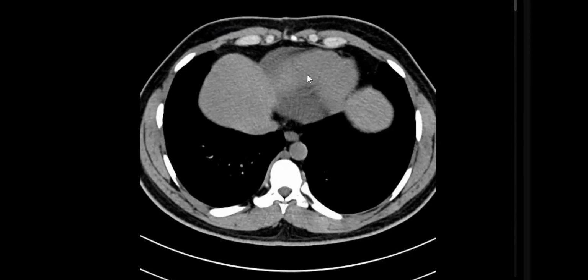Excessive smudging of the fat planes. Can we see the appendix separately in phlegmon? Sometimes no. But take care. If you see the appendicolith outside, it means rupture. So the appendicolith is very important to judge the next step. The appendicolith is a leading clue. Okay, acute abdomen. Thank you, sir. Proceed.